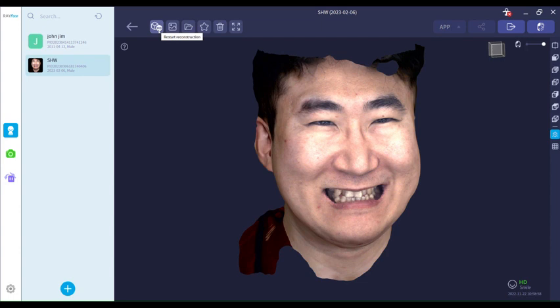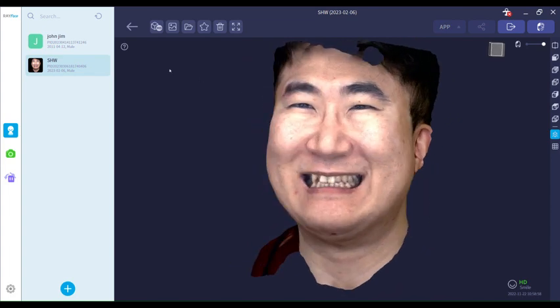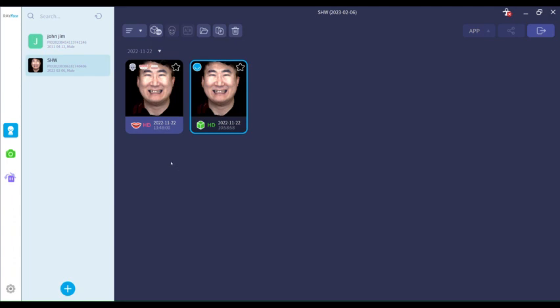Lastly, your HD reconstruction tool is at the top, and as you can see, the image is already reconstructed in this case. I will proceed to the back button. Next, we're going to double click on the left icon which has the HD and the data incorporated. Now let's take a look at that.